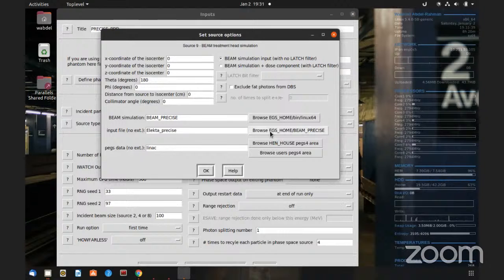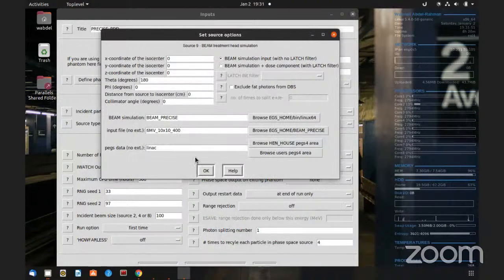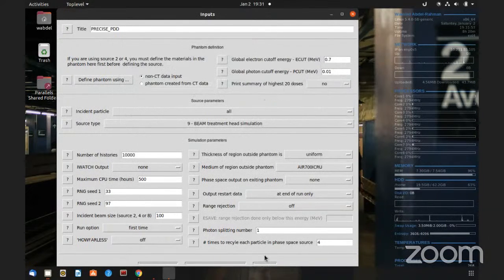There it is. And this is the input file. I'm going to change this to this input file because I have done it. Okay, sir. Because you had some problems with your input file there. So there, and there, and then when we run this, so now it should be okay.